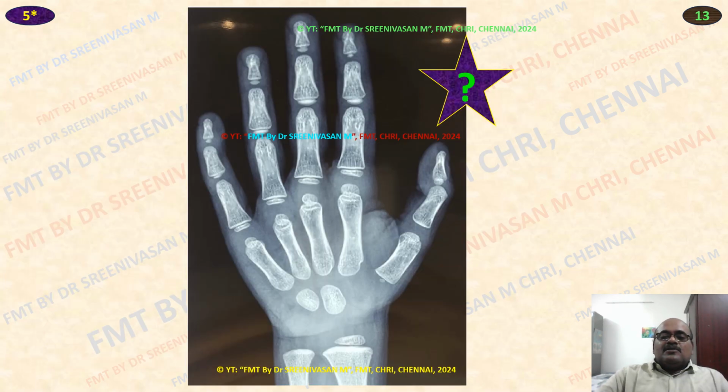Again, you try to derive the age yourself. Here again 2 carpal bones, capitate, hamate. Base of first metacarpal appears at more than 1.5 years. But here you see lower end of radius and the base of the first metacarpal also appeared. So age is more than 2 years as lower radial end and base of first metacarpal have formed. Triquetral not seen, less than 3 years, right?